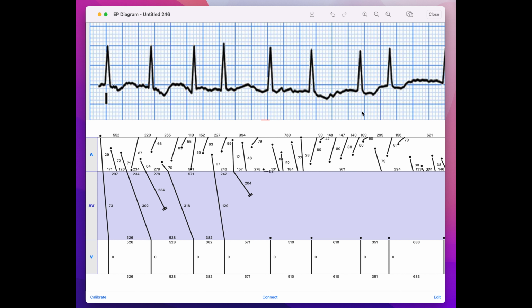So as you can see, you can add fibrillation or regular rhythms to whole regions, and you can also add rhythms to limited zones that you select in edit mode.